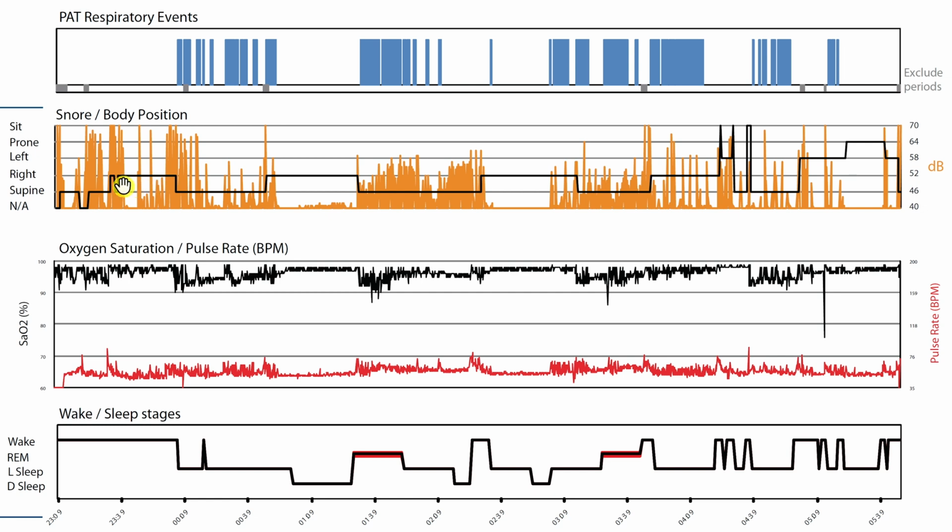So what we can say here is, well, this patient was sleeping on their right from 11:39 to like 12:09 a.m. And you can follow that all the way along. This is sleeping again on the back, right? Because this supine is over here. This gray line is the back line, or the supine line, and we can see that our trace is on that line.